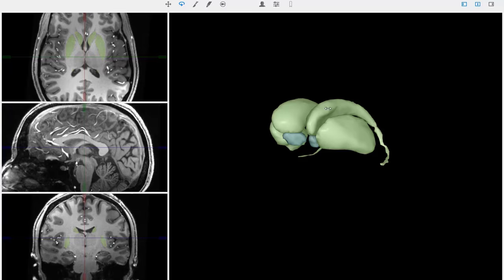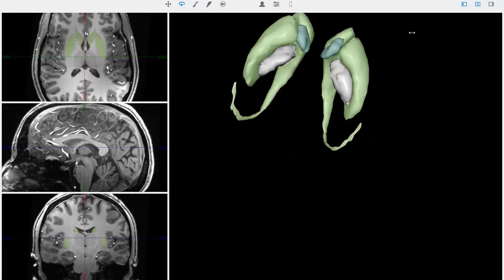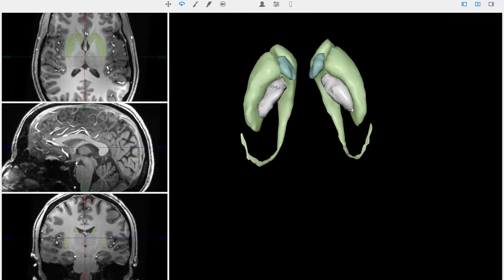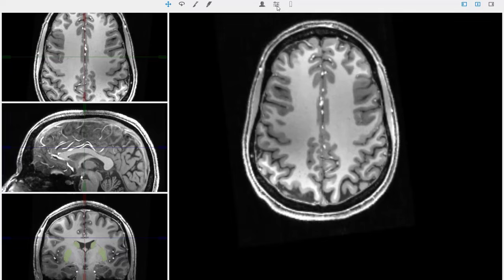So the basal ganglia is the caudate, the putamen, and then the last structure is the globus pallidus. The globus pallidus, now we're looking up into the patient's brain, so we're inferior view, is the medial and inferior portion of the putamen. Why don't we look at this from the perspective of the axial slice now? So here we're at quite superior. This is the blue line that we're cutting through, and we don't see the ventricular system yet, so that means we're not going to see caudate or putamen yet either.